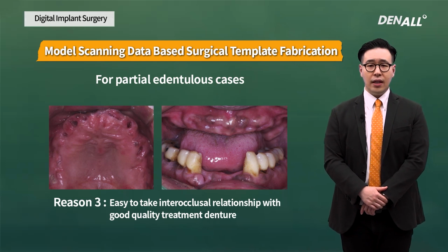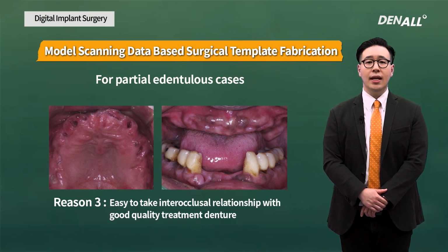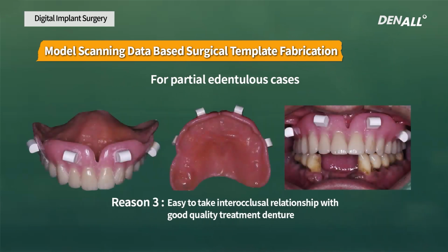And if a patient has adjusted to and is satisfied with the treatment denture, as you can see, radio-opaque markers are attached to the denture surface, and the denture is scanned with a model scanner to merge. In this case, a very stable outcome can be obtained.